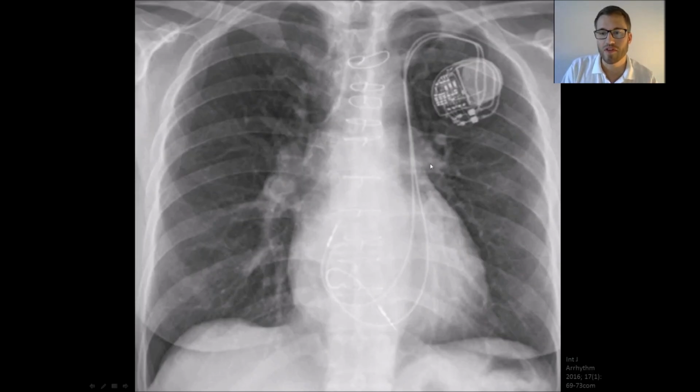I took these pictures from the web and found some colleagues who implant also from the left side over the left vena subclavia into the persistent left vena cava superior, and then making a move through the coronary sinus, a loop into the right atrium, into the right atrial appendage, over the tricuspid valve, here into the right ventricular apex.